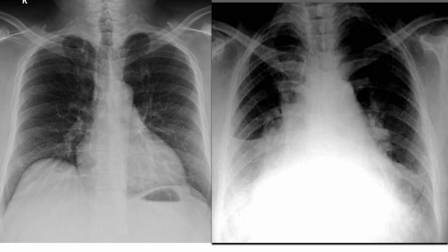Before assessment, our X-ray chest is slightly rotated and over-penetrated, which is apparent when we compare to the normal one. It's very easy to say that there is significant cardiomegaly. The hilar vasculatures are not appreciable due to the over-penetration. When we compare with the normal one, there is more bulkiness in the bilateral hilar, usually called fuzzy hilum.